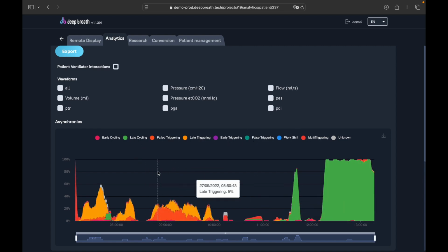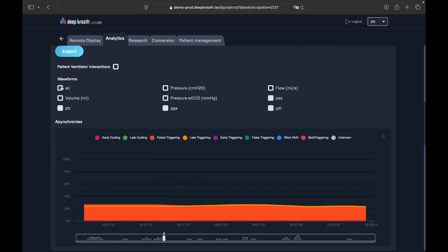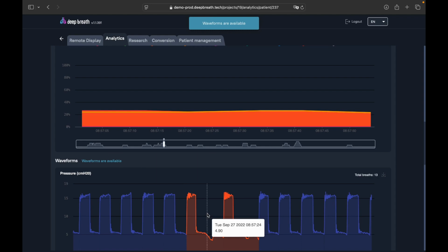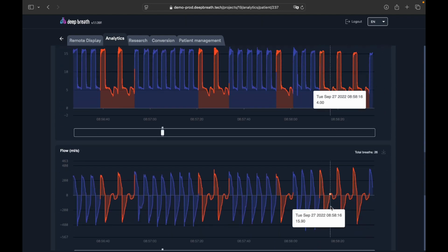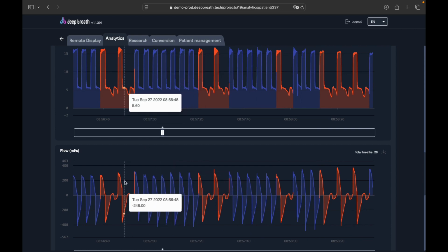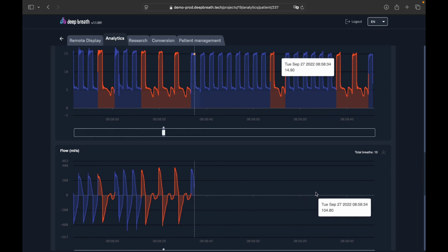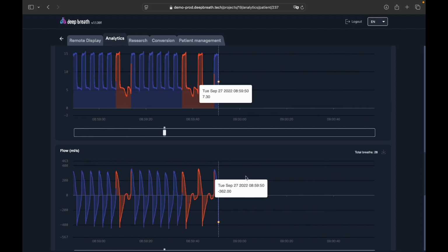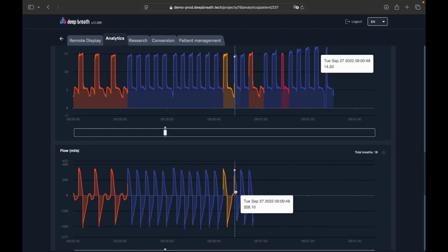In the end, we can check for the beginning, so that there were really ineffective efforts, and they really were very classical, like in any research paper about asynchronous cycles. So I think it's around 100% accuracy of detection, and this is late triggering.